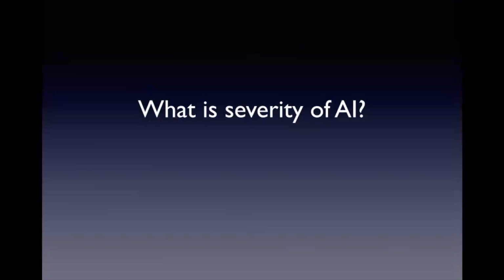Okay, so what is the severity of aortic regurgitation in this case? What do you think, Flora? I think the presence of holodiastolic flow reversal, even though we may not be catching a full Doppler jet, at least in the descending thoracic aorta, would suggest to me at least moderate to perhaps severe as well.